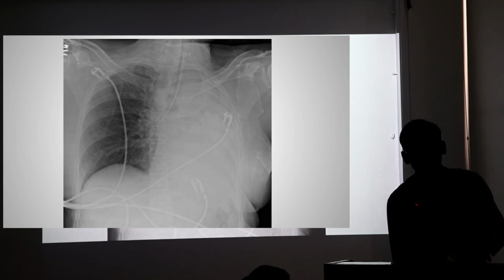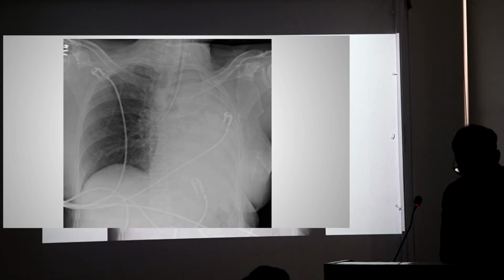Yeah, this is one lung intubation. So it has gone too much over the right mainstem bronchus. So we have to withdraw a bit. Otherwise, the patient will not be able to maintain.